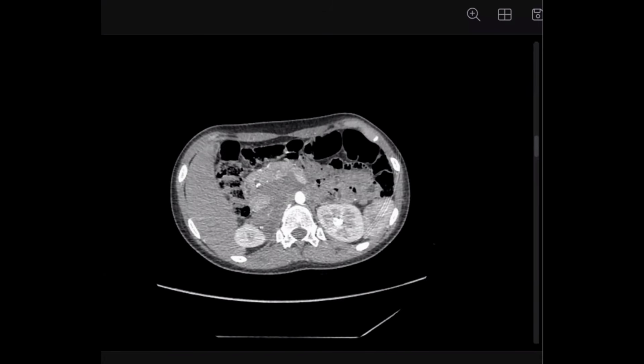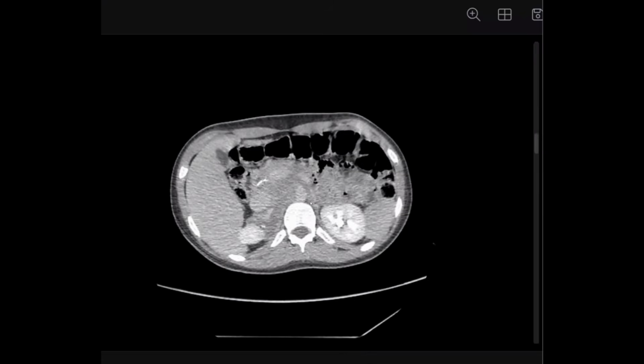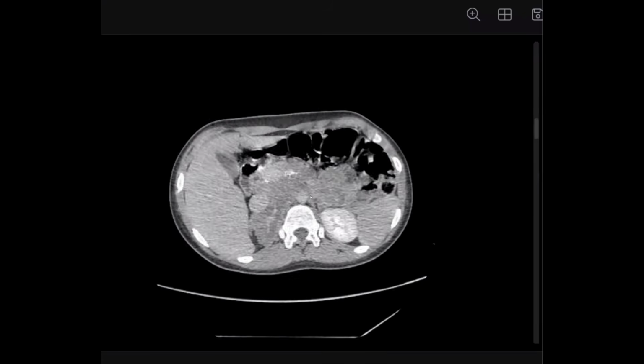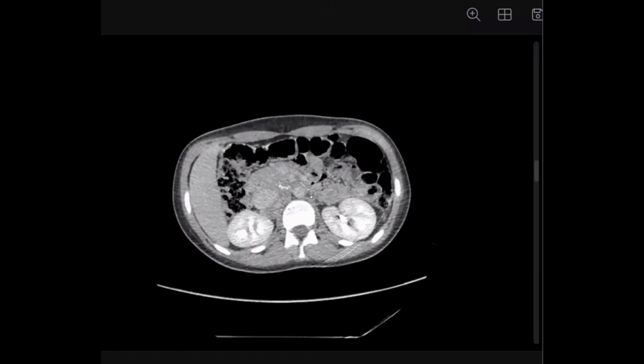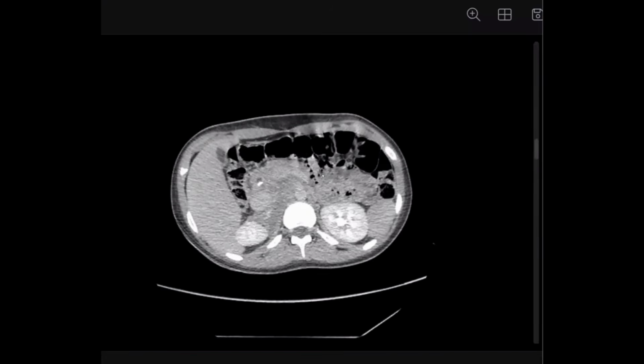This is the arterial phase and this is the venous phase. It's not venous really, it's delayed phase. Is it enhancing or not enhancing? No significant difference is noted between the phases. Maybe minimal arterial contrast enhancement. Yes, very minimal.